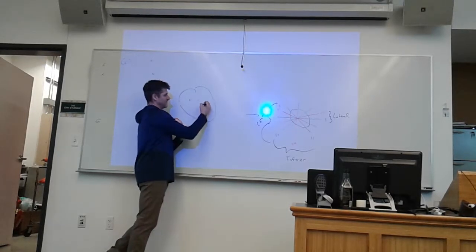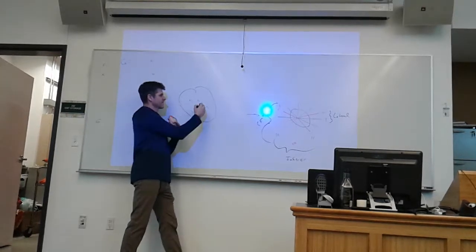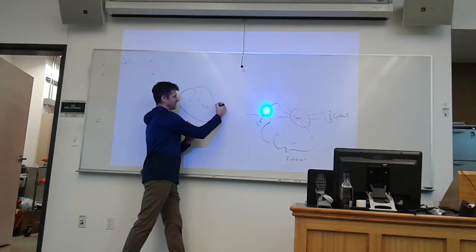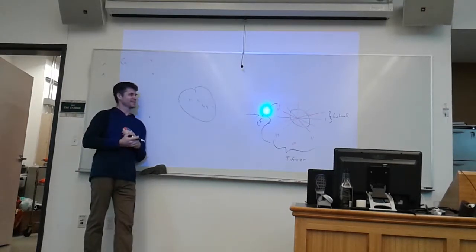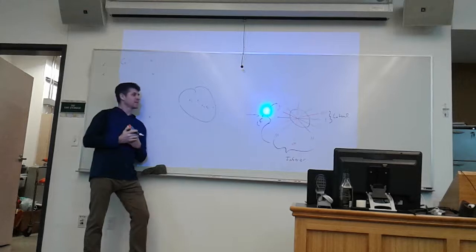V2, V4, V3, V5, and V6. I write them smaller because they're going around the corners. You can't see them. So this is what we're looking at.